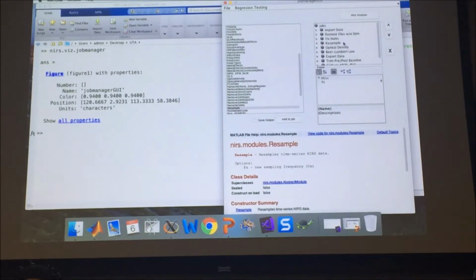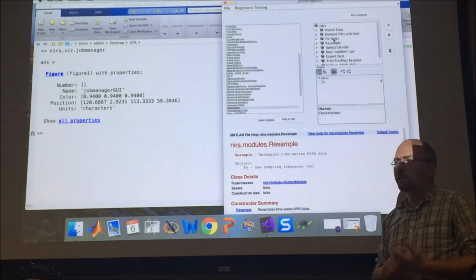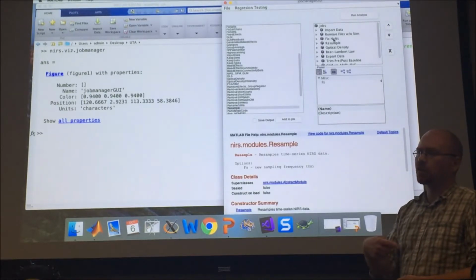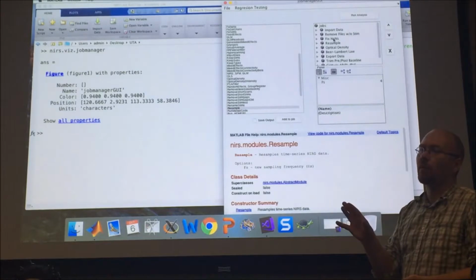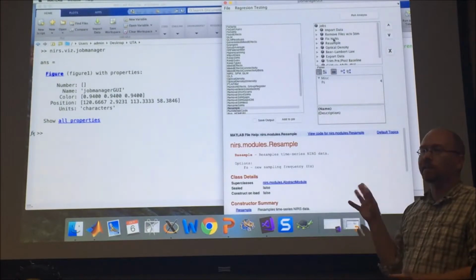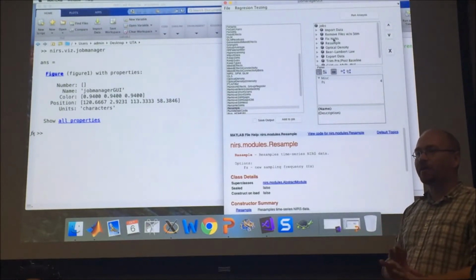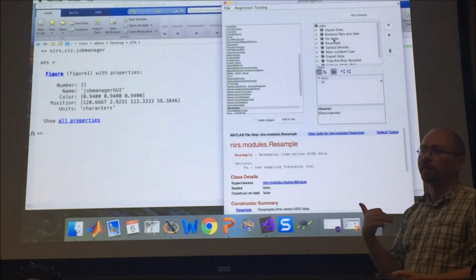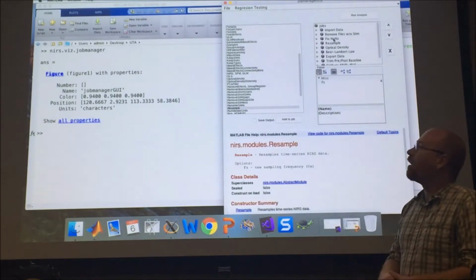Anyway, so this is the job that we're going to run. It's going to first start off with removing any files without stimulus. It's going to fix the not-a-numbers. Some of the systems, if they lose data in the transfer or saving, actually store it as not a number, and so that code removes all these not-a-numbers that cause problems. If you're collecting data on the NIRx system, running that job won't have any effect on your data whatsoever. But I always put it in my default pipeline because it also doesn't hurt to run it.